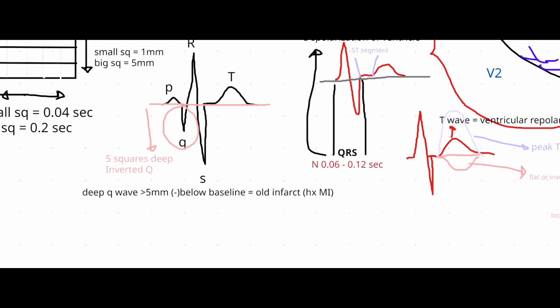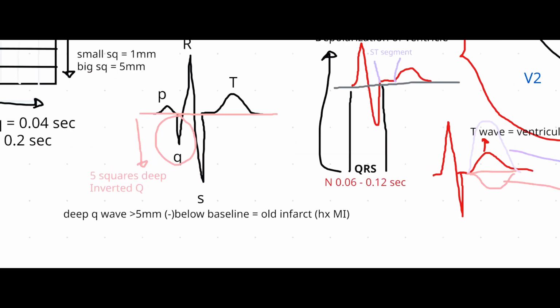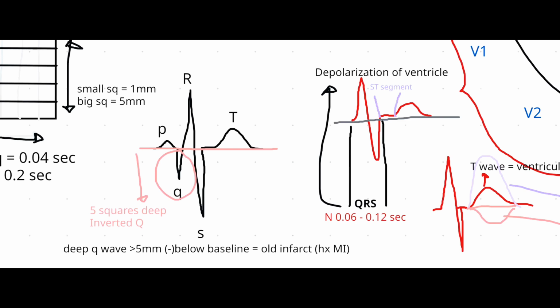Remember, it's part of the QRS complex. So then you will measure this from the beginning of the Q to the time that it comes back to the baseline from the S. That's your entire QRS complex. But remember, that's width. That's horizontal. This is vertical. Okay, so we're measuring vertical in millimeters or in amplitude, or we're measuring width. That means that it took longer for electricity to flow through the muscle or that part of the heart, the myocardium. Okay.